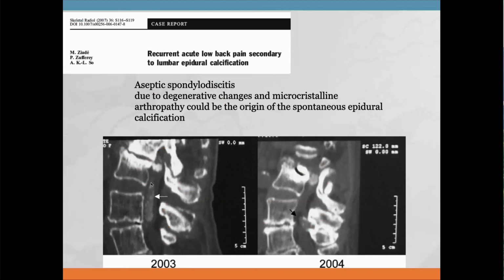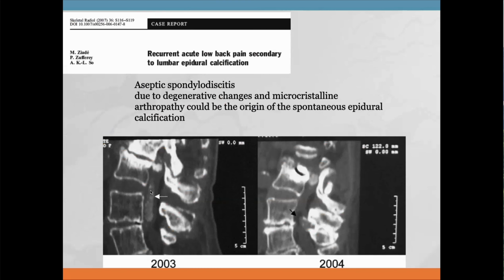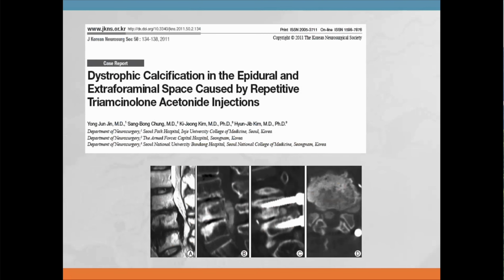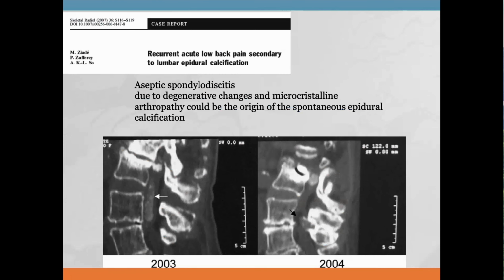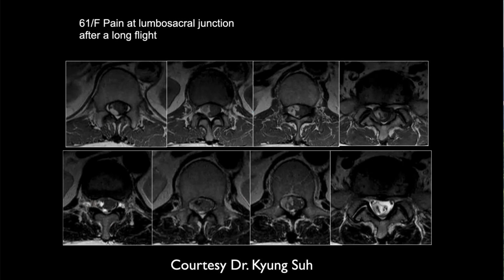And this is just another case where you can, so that one was due to a parasite infestation. Here's another case where you can see calcification in the space there. This one was, okay, and then here's one that's thought to be due to steroid injections, repetitive steroid injections. Okay.